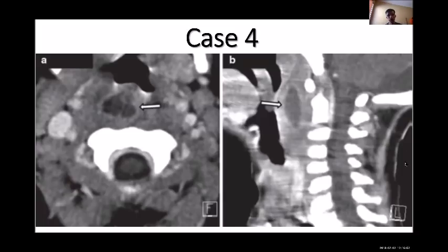Comment, anybody? There is an arrow trying to bring your attention to an area. There is a lateral view and there is a transsectional view. Yes, Aya, go ahead.